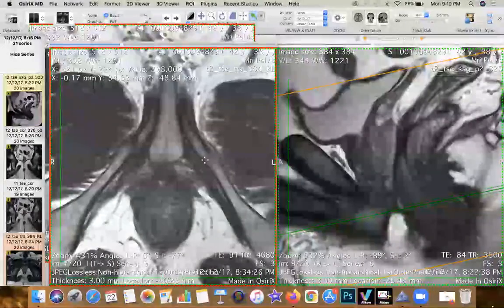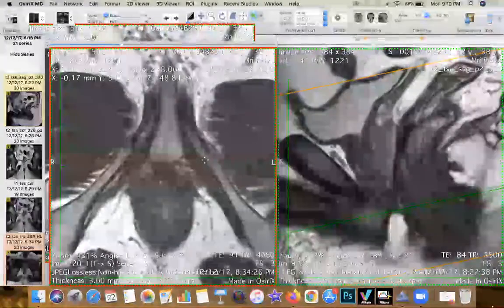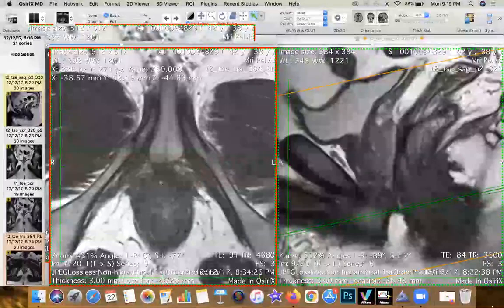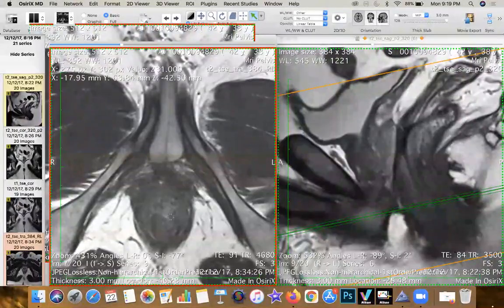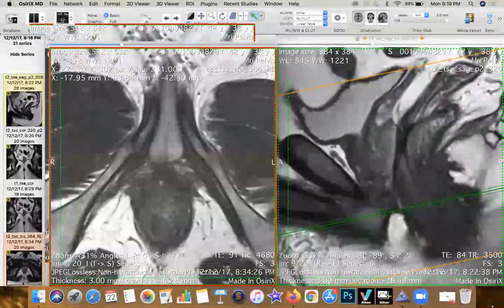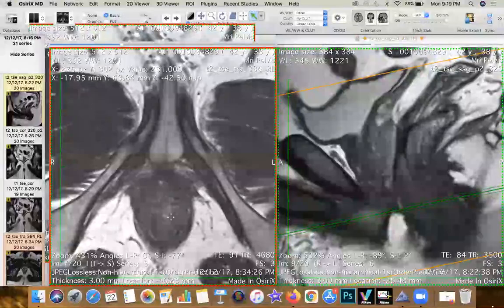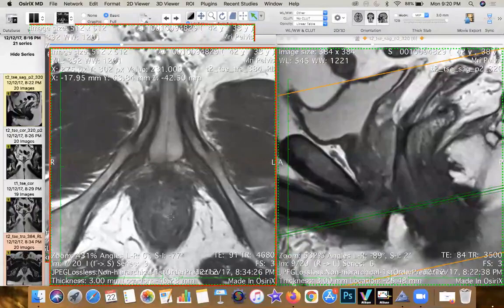And of course, you have the vulva, which is the composite of both these structures. So that's the medial compartment. And then the posterior compartment is the anal canal and the sphincter mechanism. So all these three compartments can have their own unique interplay, and you need to know each of them very carefully. I'll finish the male perineal anatomy, and then I'll try to pull out a case of female anatomy and describe that to you all also in great detail.